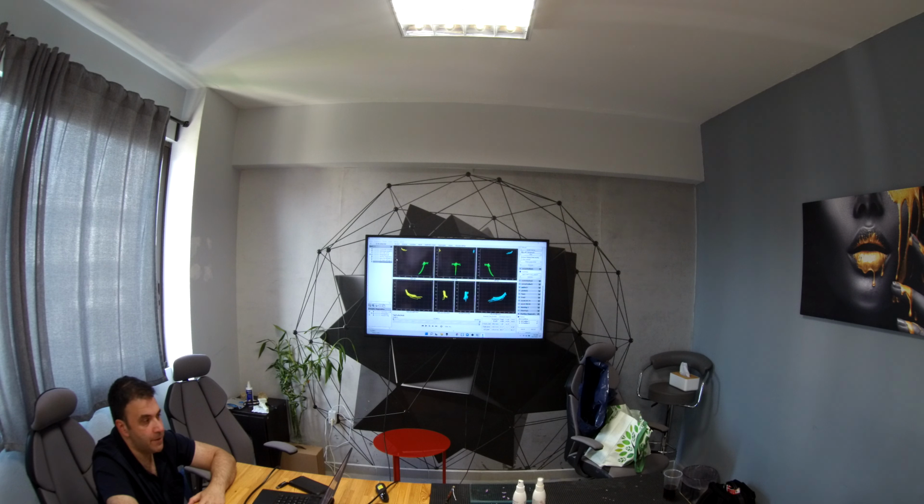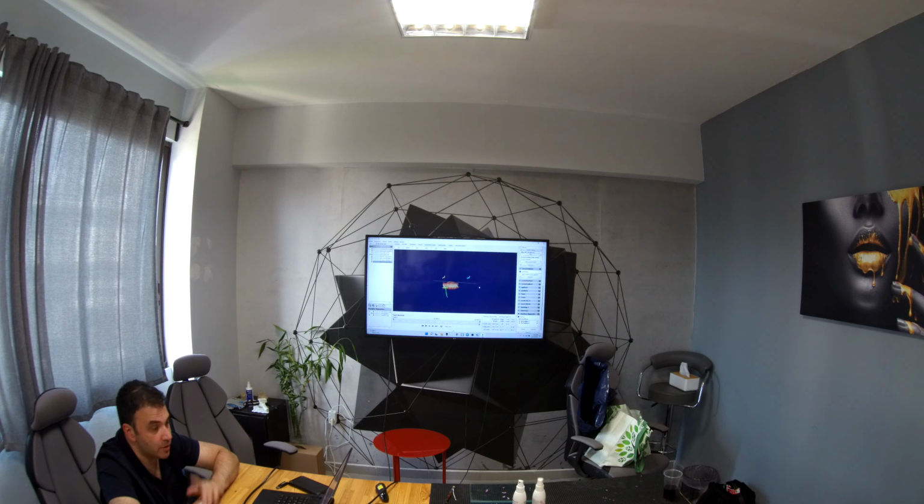And right now we have, this is the 2D view. This is a view of the axiography. This is the view of the models. Very important, what I didn't do before. And let me think how to show it to you. What is very important before we go there?